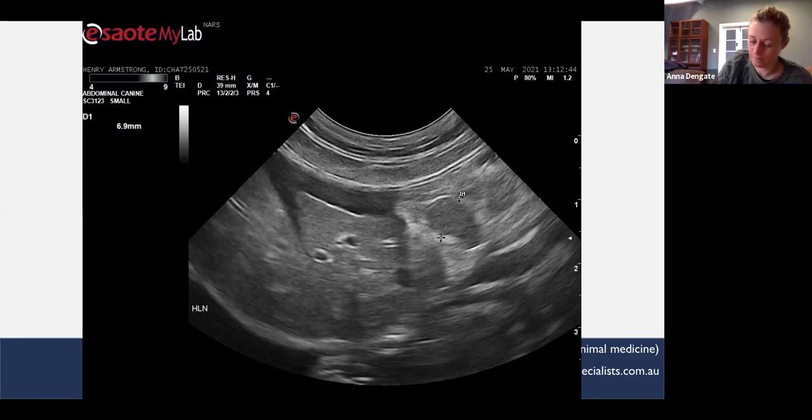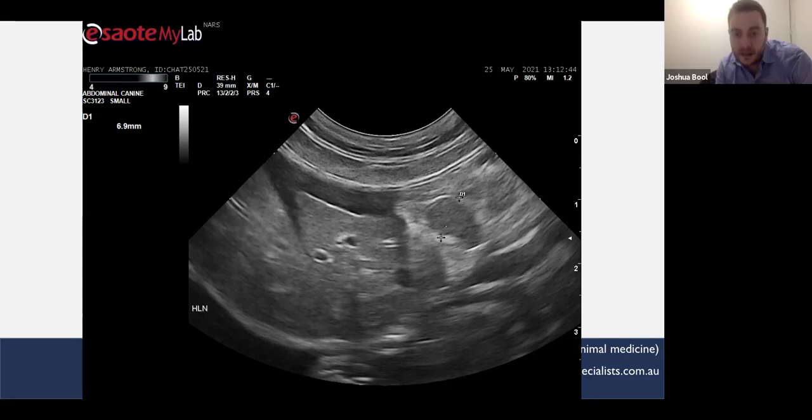Good. The liver itself, I think this is where it gets hard with still images, but it does look like it has mixed echogenicity there. I agree. There looks like there is free fluid between the liver lobes as well, just distal to the portal vein.